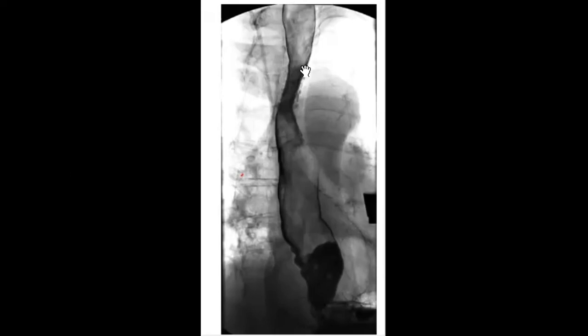They are very small, you can say millimetric in size. And they look like they are communicating, and maybe some of them with a narrow neck. About the mucosa, you can see that inside there are no mucosal irregularities. And I see that most of you have very nice answers about the lower esophagus, that there is a dilated lower esophagus and no featureless lower part of the esophagus.